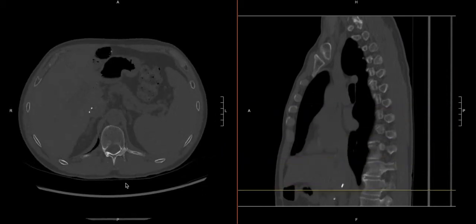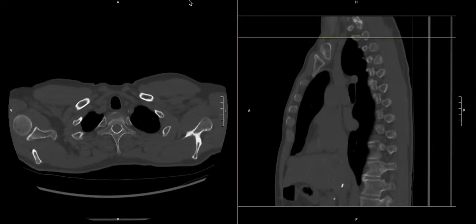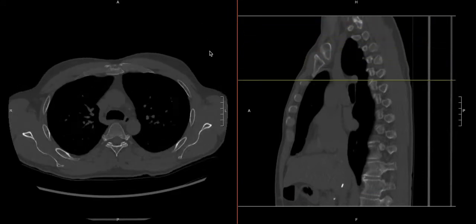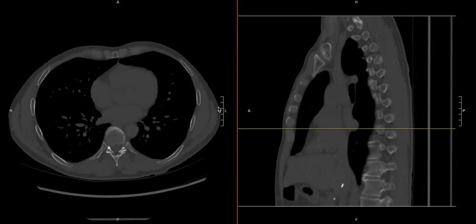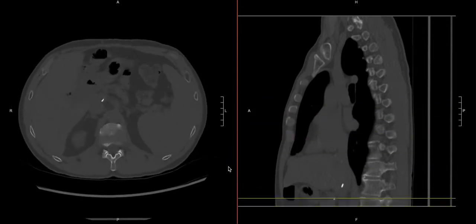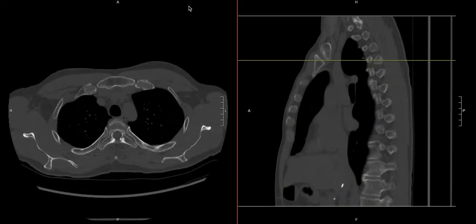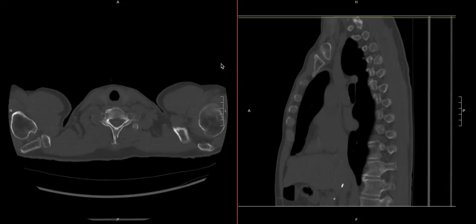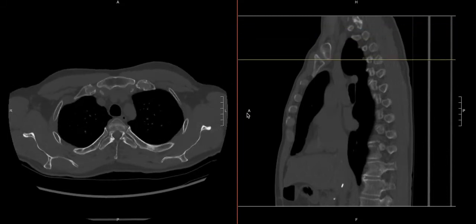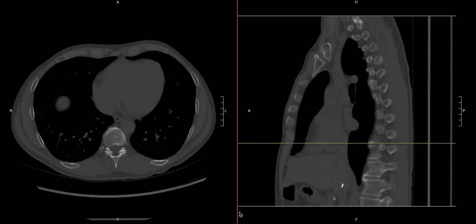And then we'll do the same thing on the other side. We can come up to the beginning, look at the posterior aspect. Is there any pathology, anything unusual? And again, you can always go back and forth if anything catches your eye. Look at the lateral aspect. And then we'll look at the anterior aspect and see, is there anything unusual?